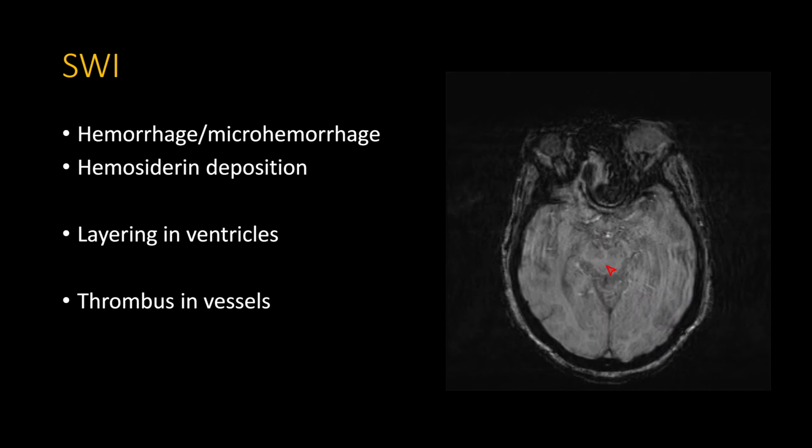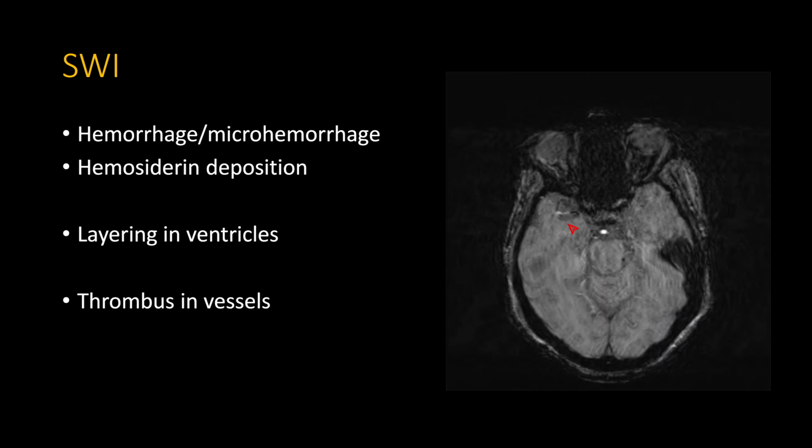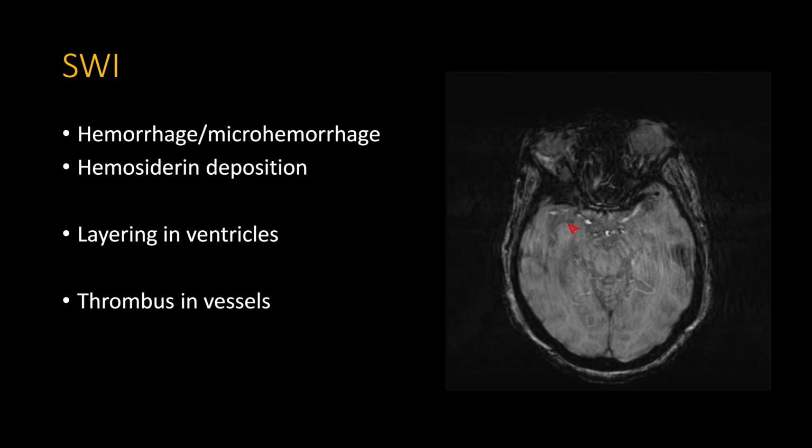And that can actually be pretty sensitive, especially for thrombi in these distal branches. You see this little nice dark blob here. Because it's susceptibility artifact, it actually expands and looks more prominent than the actual adjacent vessel. So the one thing is to not confuse them for potential hemorrhage, right? If there's a thrombus in a vessel, it'll have susceptibility artifact, so don't mistake it for hemorrhage, because if you call something hemorrhage, perhaps that would exclude the patient from some therapies and interventions, things like that.